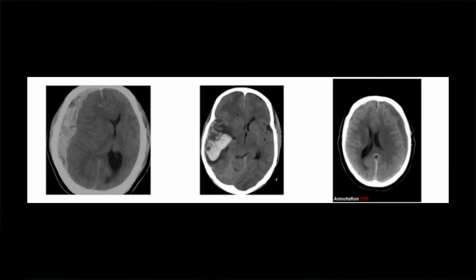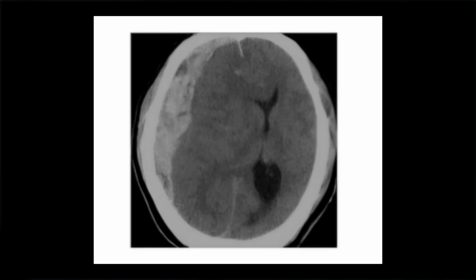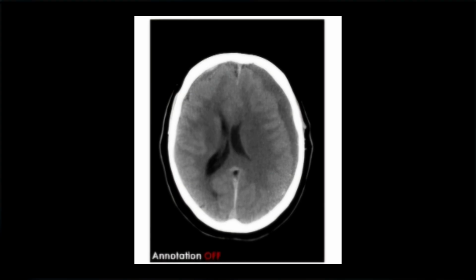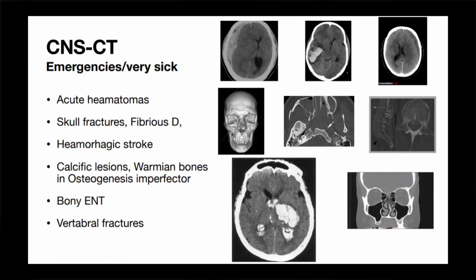So in less than 6 hours, if a patient has fallen off a boda, or has had an accident, you need a CT scan, and then you can define hematomas. Like in that case, you can see this epidural hematoma, you can see this intracerebral hematoma, and of course this is a chronic subdural. A chronic subdural, the MRI can also come in. Yes.